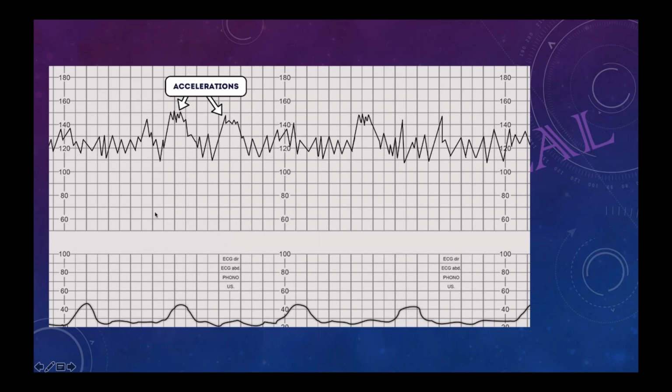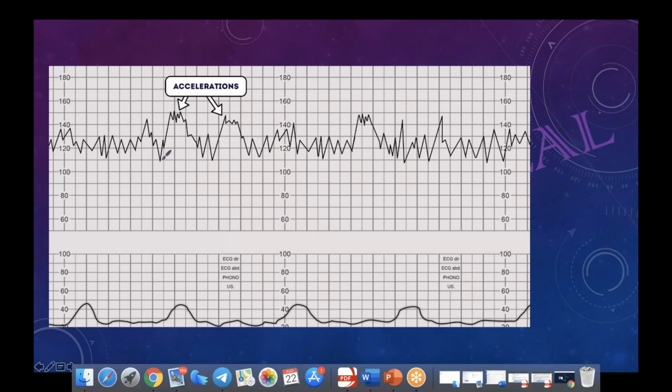How did I calculate 45 seconds? Okay, let me tell you. Acceleration is a good sign, not a bad sign. See here, this acceleration starts from here, and ends here, and this one is 30 seconds.